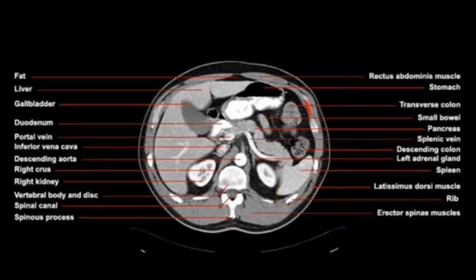And at this stage, we can still see portions of the colon over here on the left side of the patient's body. Another organ that we can see that we could not see in previous images is the pancreas. The pancreas is a lobular structure that extends from the area of the spleen all the way over to the central abdomen. It does have this characteristic lumpy appearance. It's a long, slender organ, and you'll also notice this blood vessel here, which is closely associated with the pancreas. That's actually the splenic vein, and sometimes we can also see the splenic artery.